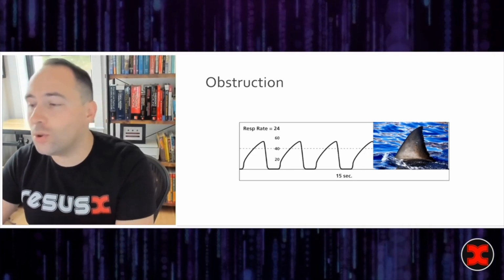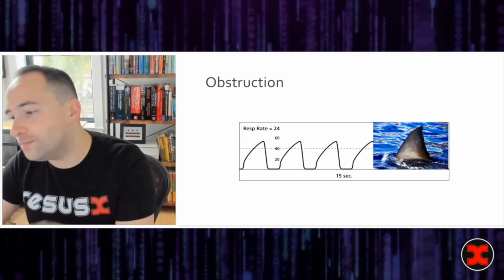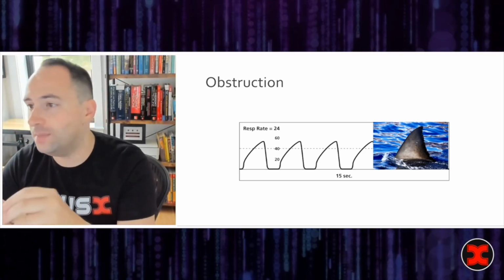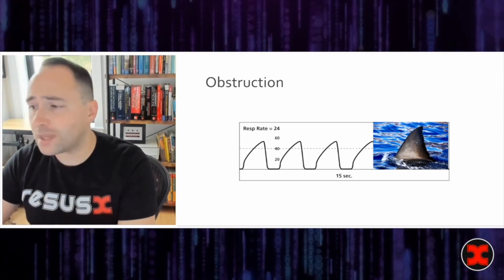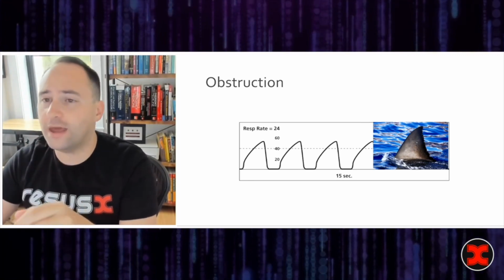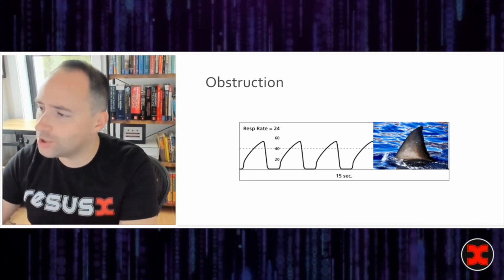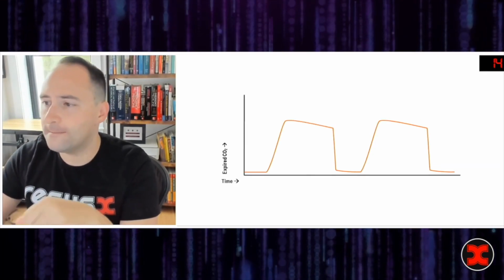One of the cool things about this tracing is that with the relief of the obstruction, for example, the administration of bronchodilators or relief of mechanical obstruction, the more conventional boxy appearance will reappear. That is to say, the shark fin will submerge and the normal box will reappear. All right.